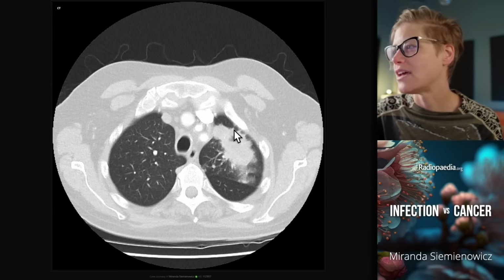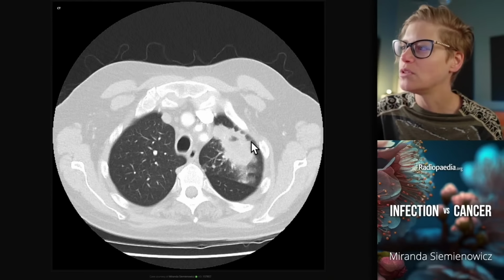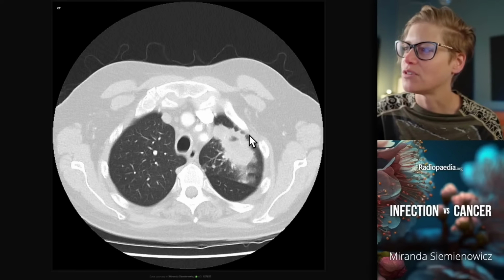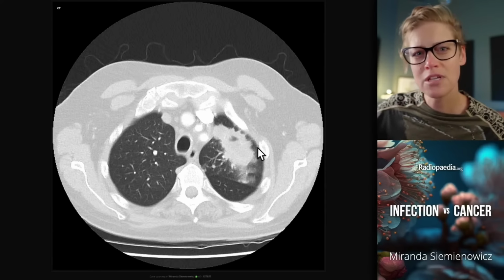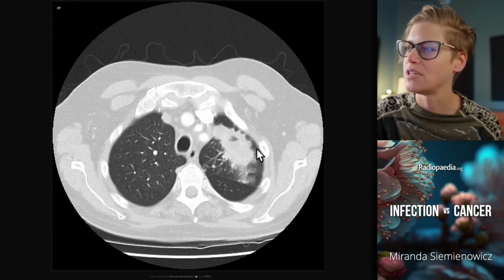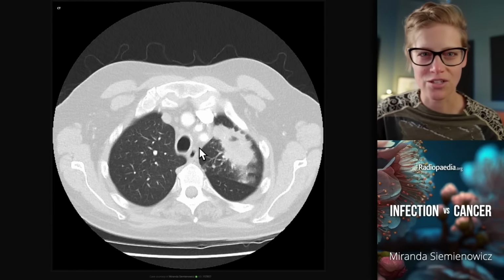And if you look at this anterior and lateral margin, you can see these hexagonal polygonal structures that are the normal subpleural lung here that are butting up against the margin of a lesion. We've got these 120-degree margins, we've got these linear radiations here, which are the thickened interlobular septations, and 3 normal secondary pulmonary lobules that come up right up against the mass-like consolidation, which is what this lesion is comprised of. And then the lesion itself is filling these lobules, showing you that the lung here is in charge.